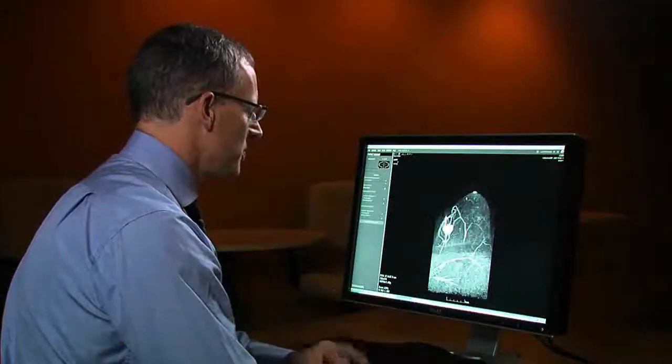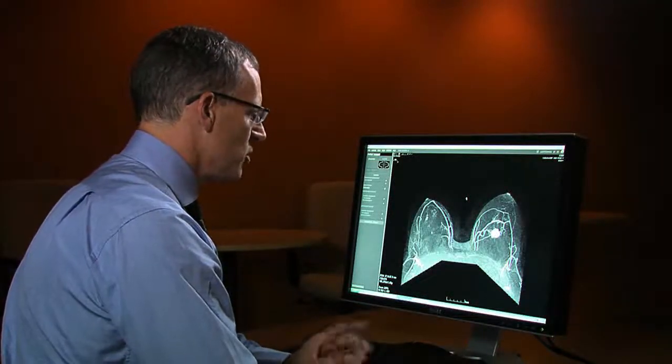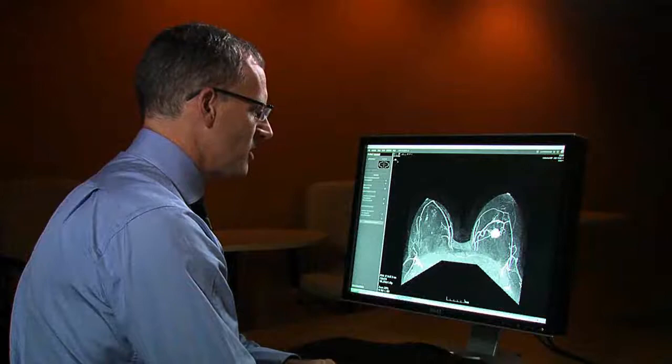By the way, this patient was in her mid-50s. She had just been diagnosed with invasive ductal carcinoma in her left breast, and she was presenting for a staging breast MRI. So the clinical question here is, is there any burden of disease elsewhere, either in the same breast or in the contralateral breast? Well, we can see the index lesion on the left side fine.